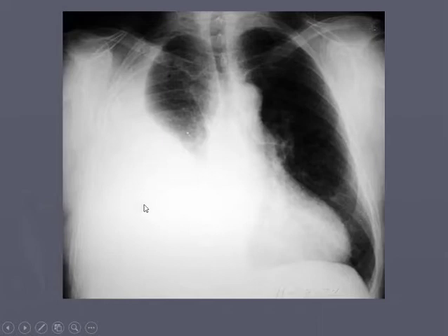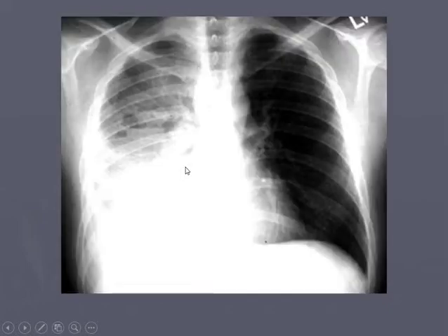And it's probably not from heart failure because our left field is completely clear. So if it was from heart failure or pulmonary edema, we would see, not always the same, but typically would see some effusions on both sides. This is unilateral, so it's probably from some other process. Again, another example, just this big, you'll see like a meniscus of fluid, and it just sort of sits right there. Typically crawls up the edges of the space. So you're seeing a big density. You can't really see the diaphragm at all.